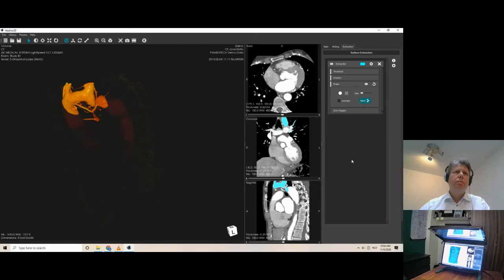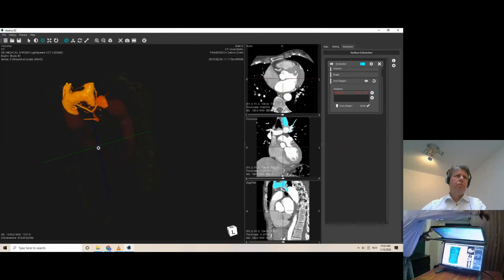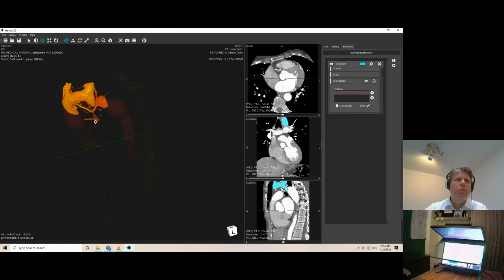Then I'm at the last step. So this is the whole thing. I'm at the last step right now. Grow region. You see blue over here, and the elements of the 3D print you want to make over there. So I'm going to grow the region. You see this axis? You can bring it to your 3D model. Basically, it makes the selection of what you want to print. You can also do that here in this element, in the 2D screen.